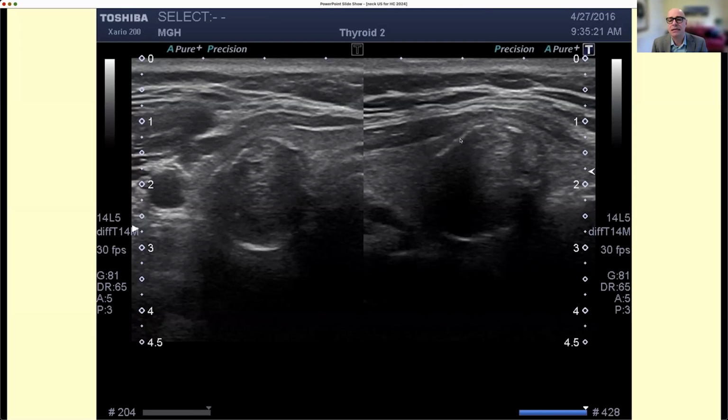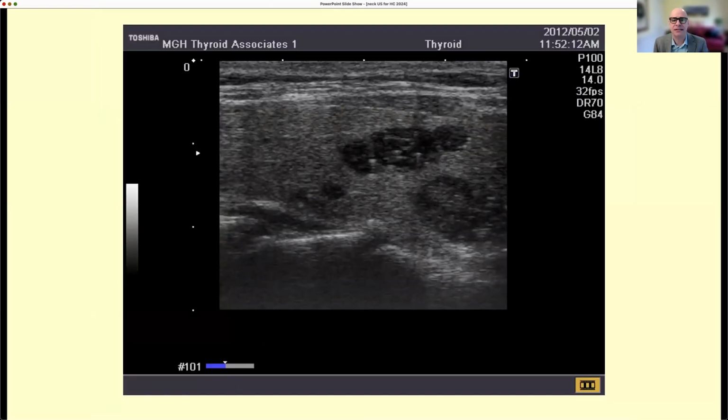Remember, as I explained to you, as the calcification becomes parallel to the ultrasound beams, the calcification disappears because it doesn't reflect echoes back into the machine. It bounces them laterally, maybe, or it doesn't bounce them at all. You can argue there's a little bit of discontinuity here, but I would call it a rim calcified nodule that has a low but not zero risk for malignancy. When they're fractured, they're more broken. You can see the fractures and the different thickness of different parts of the calcification.